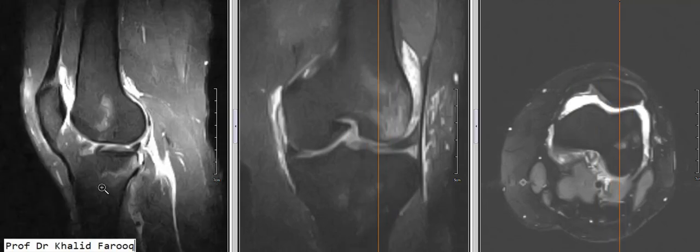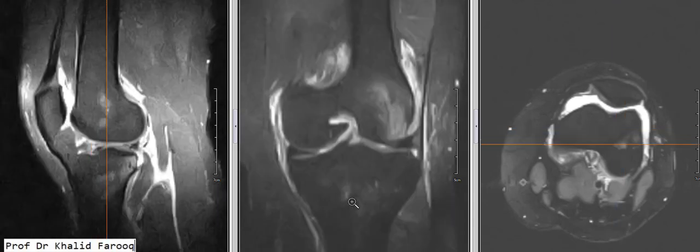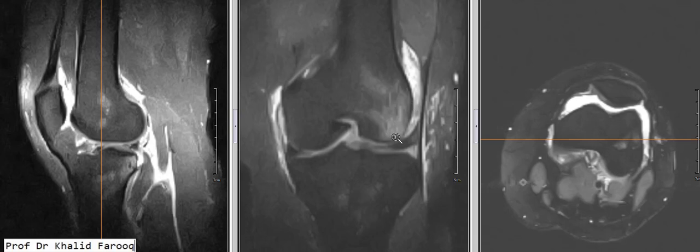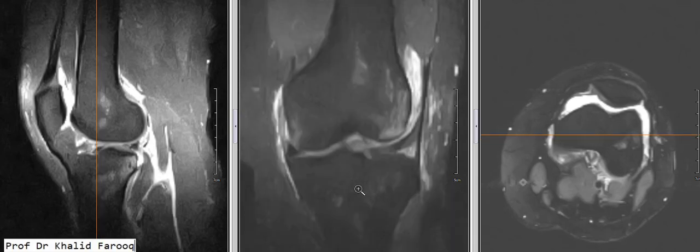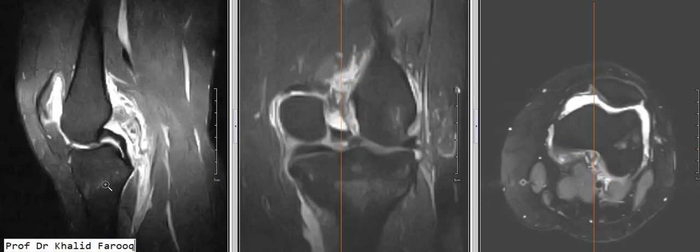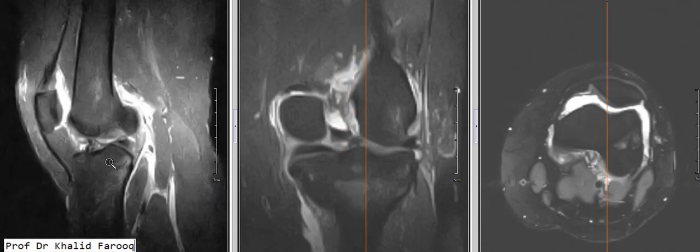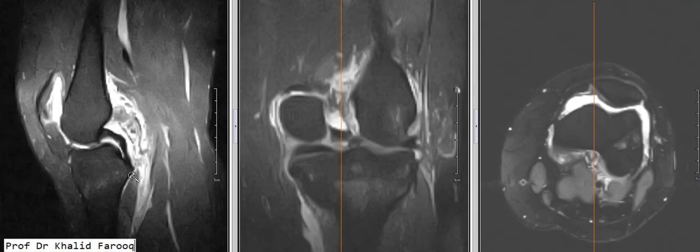Quadriceps and patellar tendon appear normal. Sprain of collateral ligaments are noted, while bone bruising is appreciated, as we have seen, especially in lateral femoral condyle and posterior edge of the lateral tibial plateau. Joint effusion is also noted. We can compare ACL. This one is acute injury of the ACL with normal appearance of PCL. Soft tissue edema is noted in popliteal fossa, especially involving popliteus muscle.